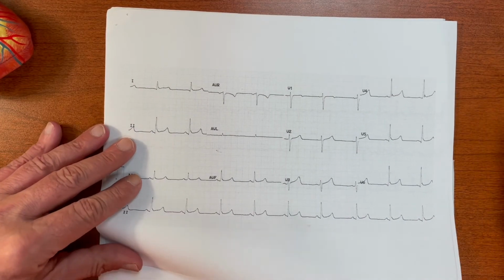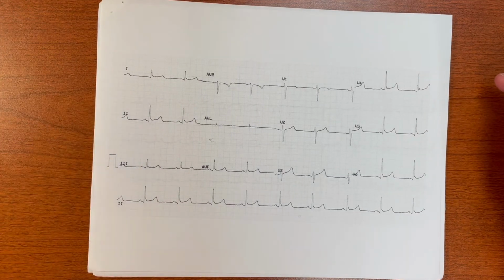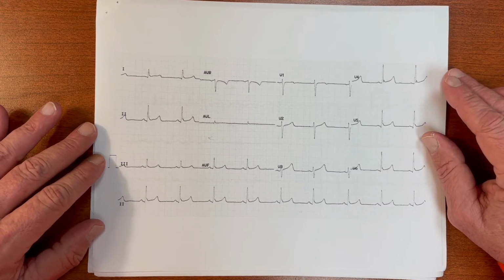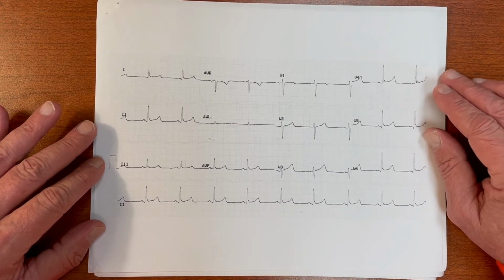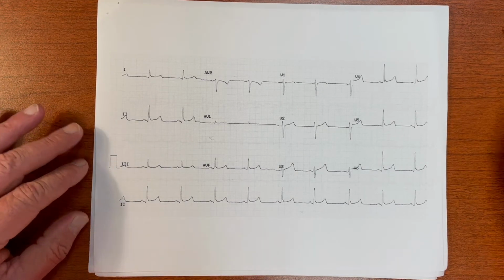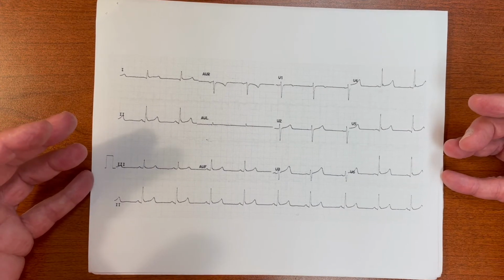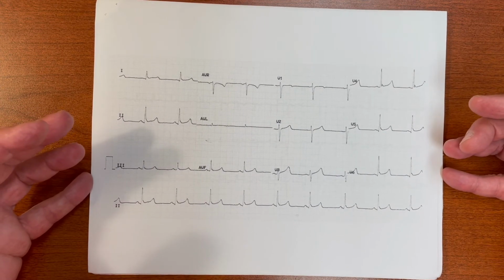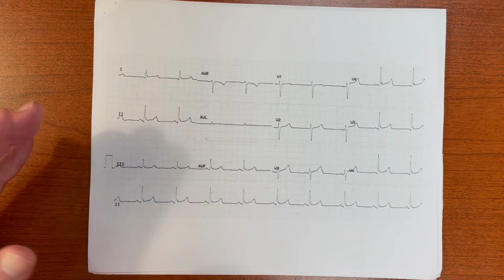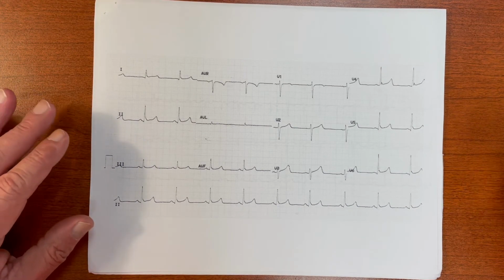That having been said, when we have diffuse mild ST segment elevation, we think of two diagnoses immediately. We think of pericarditis and we think of benign early repolarization, BER, which eventually in your lifetime will be proven to be a misnomer. Right now it's thought to be fairly benign, but as we do more work with channelopathies, we start to understand that there can be malignant forms of benign early repol, but most of them are not, so it still retains that nomenclature, okay?